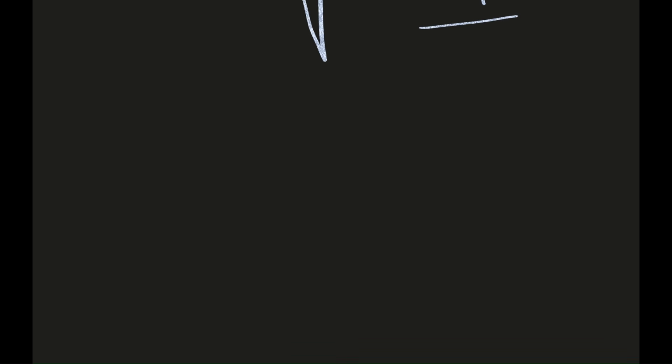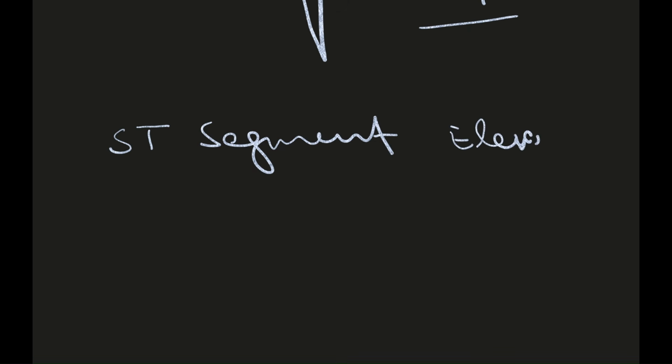The next most important thing is ST segment elevation and non-ST segment elevation.